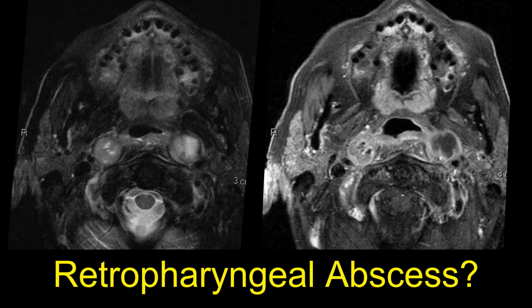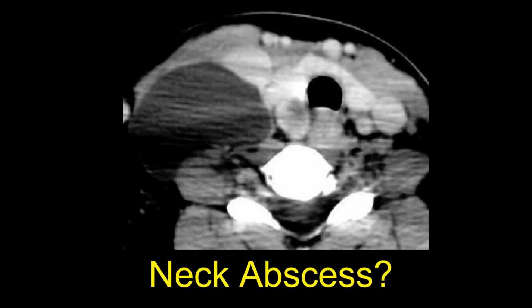Now we also want to differentiate that from lymph nodes in the retropharyngeal space. So here's an axial T2 weighted MR, and we see these two big rounded retropharyngeal nodes. That's where we often see that. You see on the right-sided image, that's an axial post-contrasted T1. It looks kind of like a fluid collection with surrounding enhancement. And sometimes in the pediatric world, for example, these are called retropharyngeal abscesses or necrotic lymph nodes or suppurative lymph nodes. That may be a fluid collection with surrounding enhancement. In a child, your lymph system is hyperreactive, so we may get big, impressive nodes sometimes.